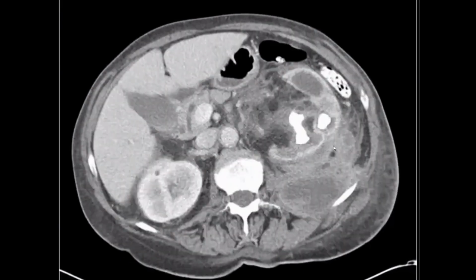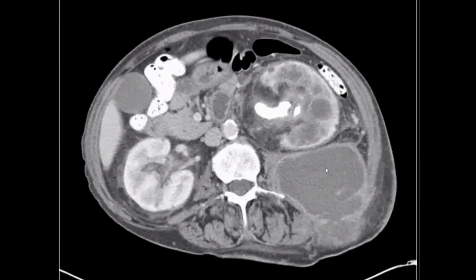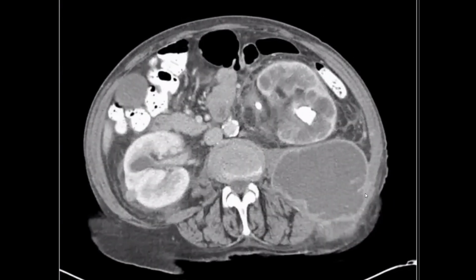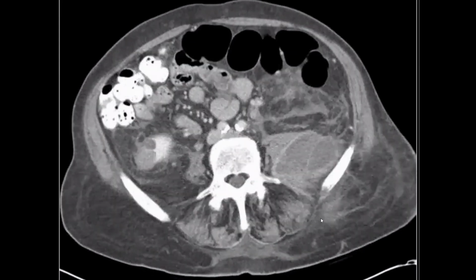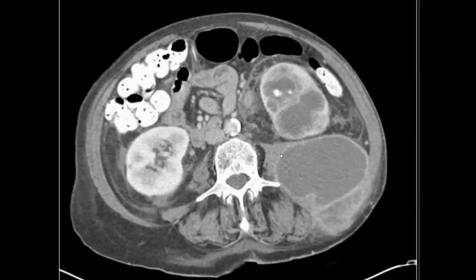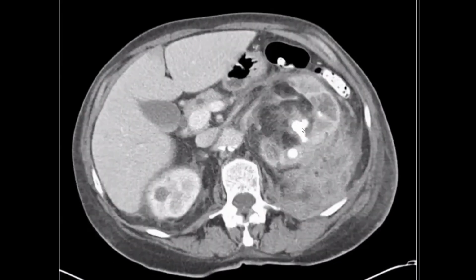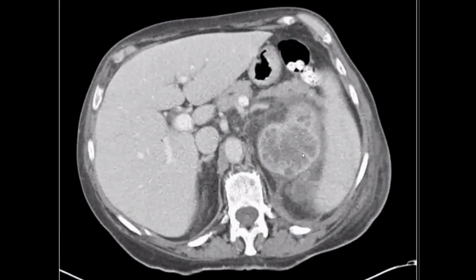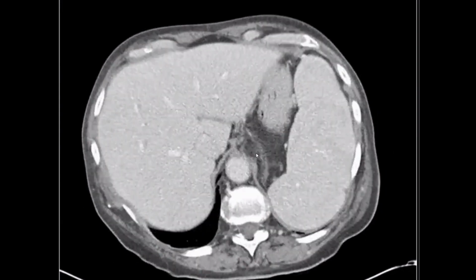Also, there are necrotic areas, enhancing, and necrotic collections in the left perirenal space, and these are also extending along the posterolateral posterior abdominal wall, crossing the abdominal wall posteriorly. There is also possible involvement of the left psoas muscle. The kidney is displaced by these enhancing collections. I am looking at the status of the renal vessels.